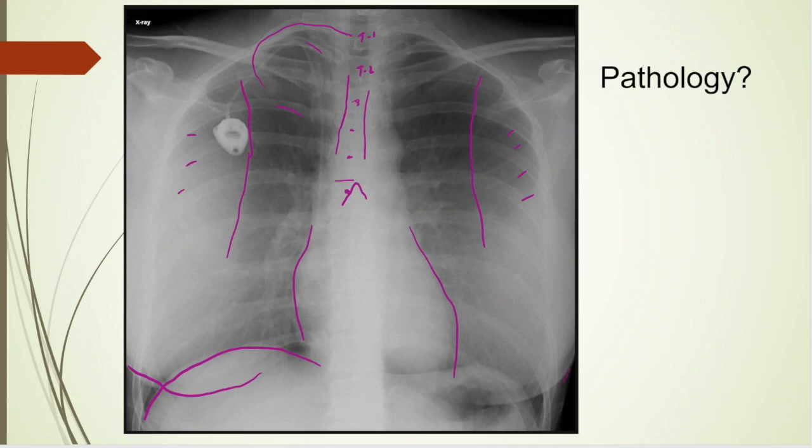We go to E. Here's breast tissue. Here is your left diaphragm, gastric bubble. So that's all normal. So you can see also, for everything else, this portocath here, and you can see the line coming here and then down. It looks like it ends right about there.